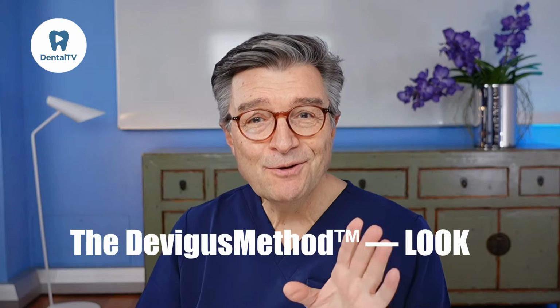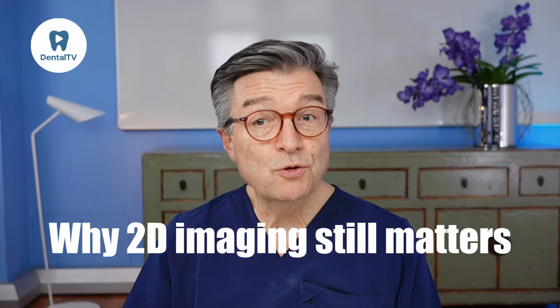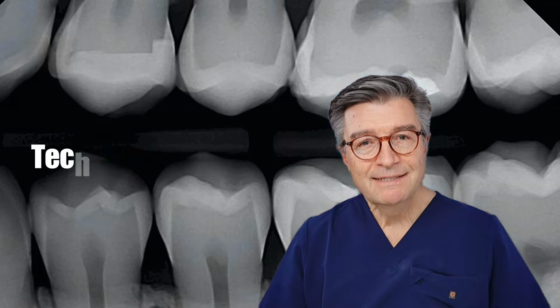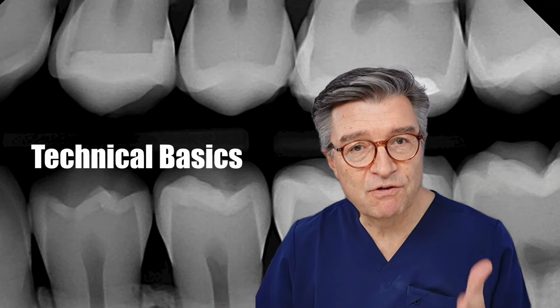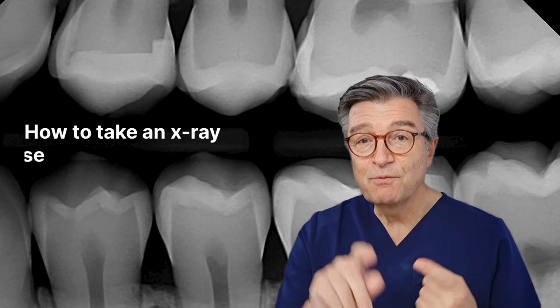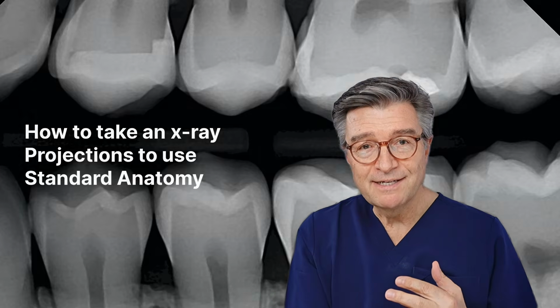Welcome to the look phase of the Devigus method. Today we start with the foundation of modern diagnostics, understanding, analyzing and trusting your 2D dental radiographs. In dental school, we were taught the technical basics of 2D radiography, how to take an X-ray, which projections to use, and what the standard anatomy looks like. Today, we reconnect with those essentials and add the clinical reasoning layer that was never fully explained.